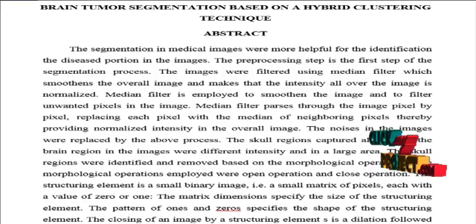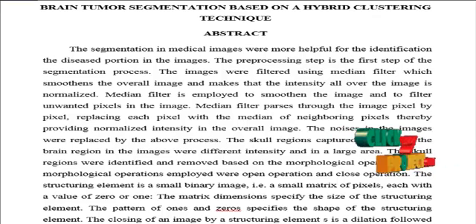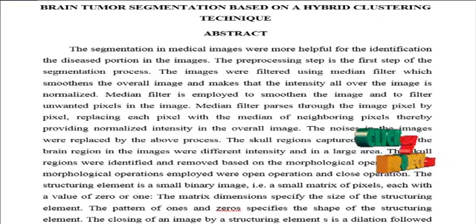Each cluster region represents regions of different intensity. The skull regions are then removed from the images based on the morphological operations. Thresholding process is employed for the segmentation of the tumorous portions in the input image.